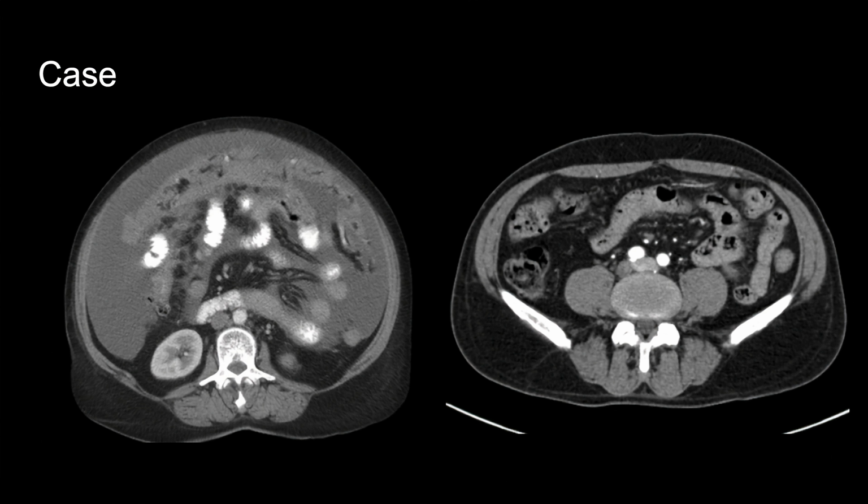There are peritoneal metastases from a primary malignancy that are spreading through the peritoneum. When you have omental caking and peritoneal metastases in a female, the most common cause is ovarian cancer. Other things that can cause this appearance include other GI cancers, things like colon cancer, pancreatic cancer, gallbladder cancer, etc. The main point here is to illustrate why peritoneal anatomy is important when looking at a CT scan of the abdomen and pelvis. The peritoneal ligaments are a highway for disease spread. When tumor invades the peritoneum, it often spreads along the peritoneum in a sheet-like fashion.